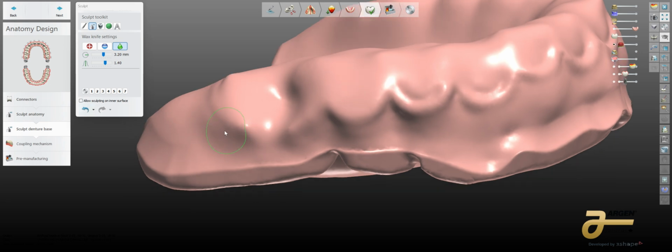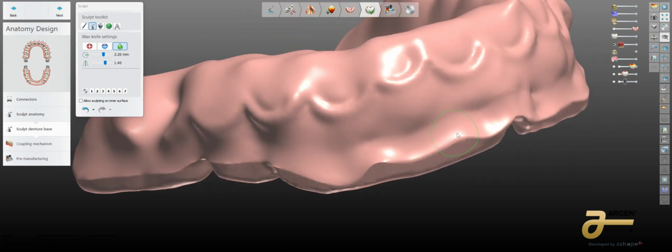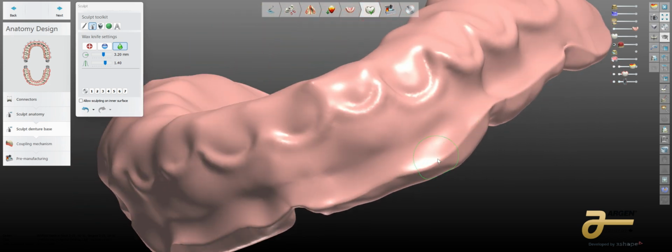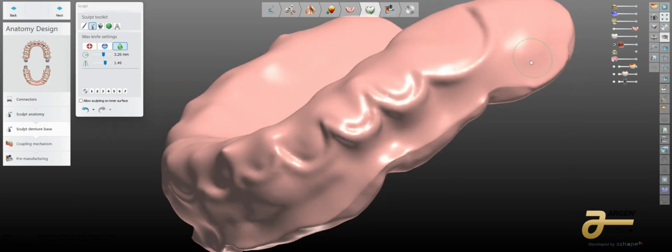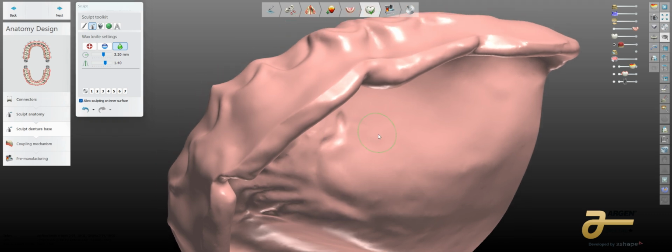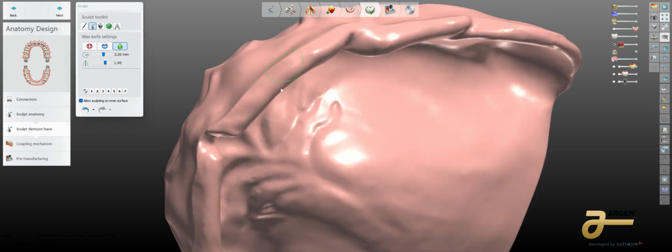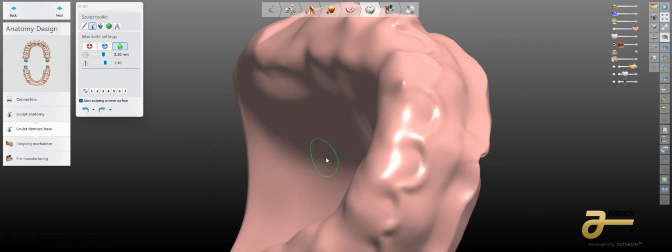Don't hit the allow sculpting yet. Just come on this outside edge, try to radius this thing a little bit. And once it gets to a point where you can't do anything more, that's where you have to be really careful if you unclick that button. And I'll show you why. So if you go ahead and allow this and you wanted to sculpt on this corner to move it away, if the ring is too much and it hits here, well, what's this doing? It's just distorting the internal here. So we don't want that, of course.